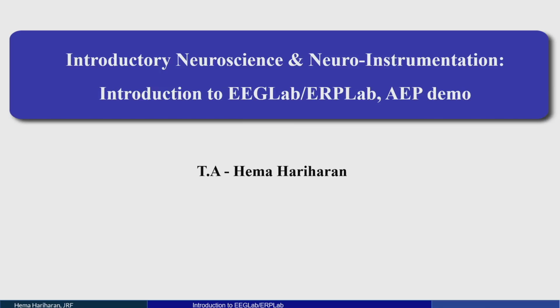Hello everyone. As a part of the introductory neuroscience and neuroinstrumentation course, I will be explaining how to do the EEG and ERPLab analysis. There are various ERPs present, and for each ERP, I will explain how to do the data processing using MATLAB and the plugins like EEGLab and ERPLab. That is what I will be explaining in this demonstration.